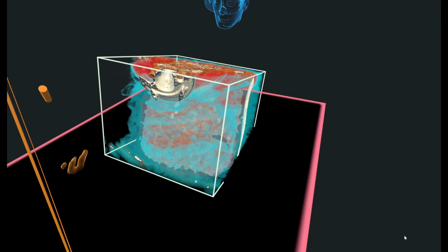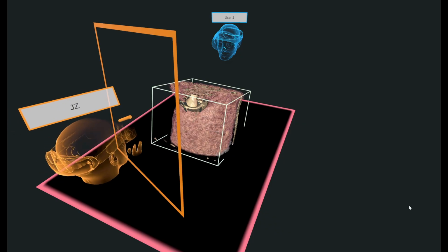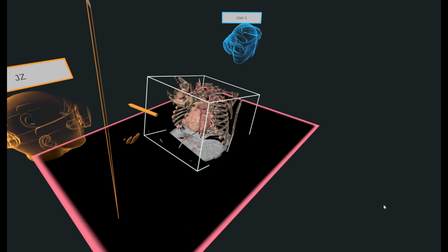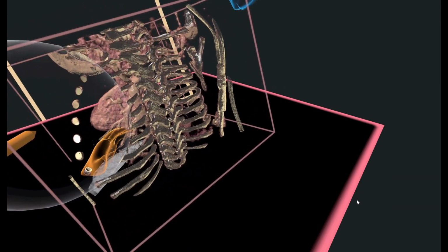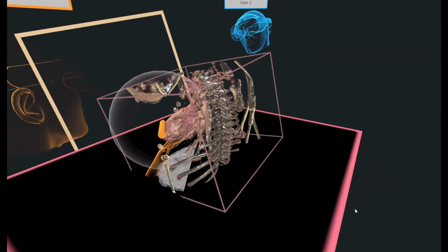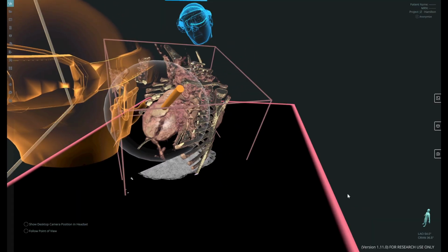And then we can go to coronary CTA or cardiac CTA, either way, and then changing the contrast, you can see more of the intracardiac anatomy and erase some of that noise. This is just me trying to do this fast. So we can see a nice PDA there. We have hidden most of the SVC and the morphologic right ventricle. We can see the anatomy of the branch PAs there very nicely.